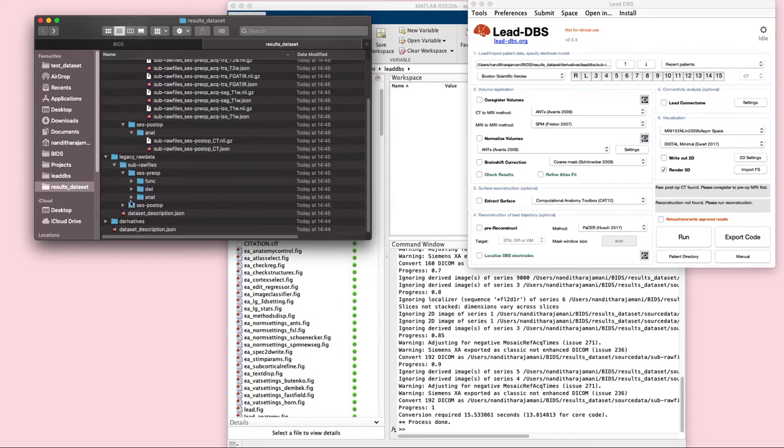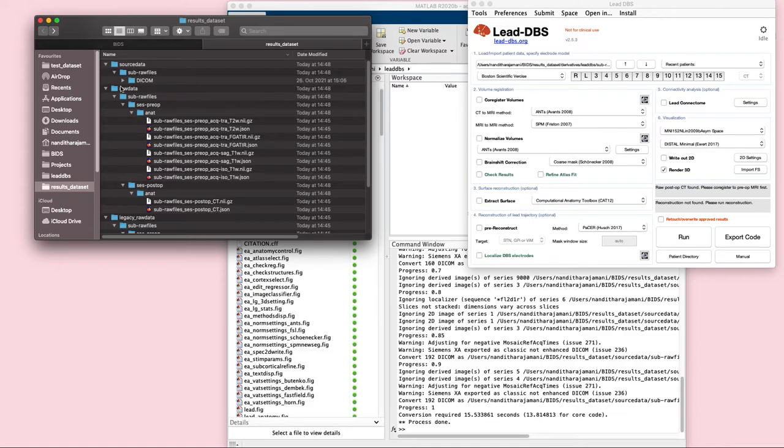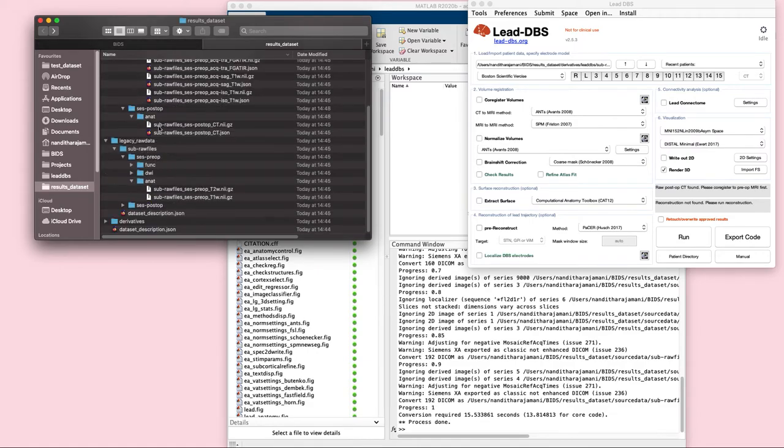While they have the same structure and maybe even have copies of the same data, they may also have different or more data in one folder than the other. For further processing, Lead-DBS will only use the raw data files and not the legacy raw data files.